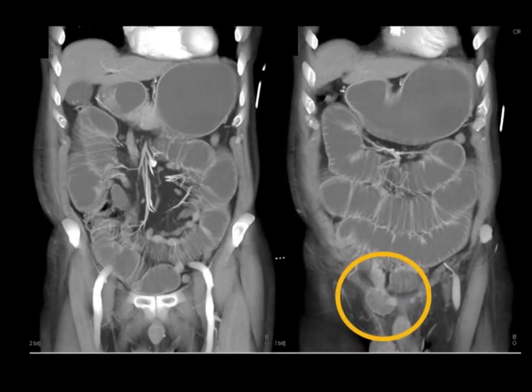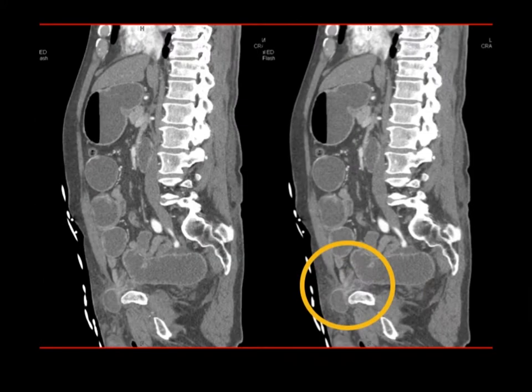And again, here it is with volume rendering, very nicely showing you that transition point, and everything we look at are transition points. And again, the volume is easier to see in coronal view. In this case, you can see it also in the sagittal view very nicely. And in the sagittal view, you also see a little bit of inflammation around the bowel loop. Bowel obstruction. Now, when talking about bowel obstruction and transitions, a couple of things I should mention also, other entities.